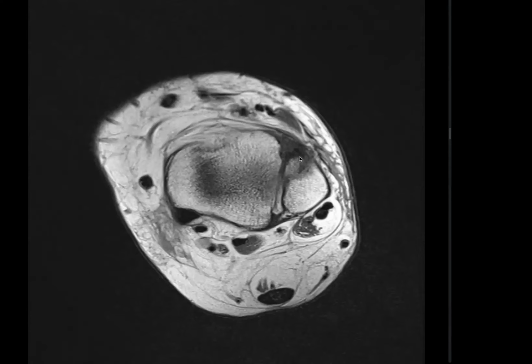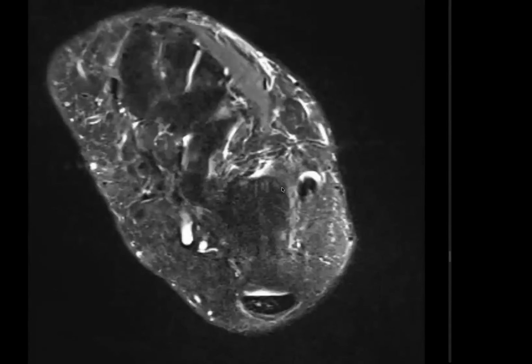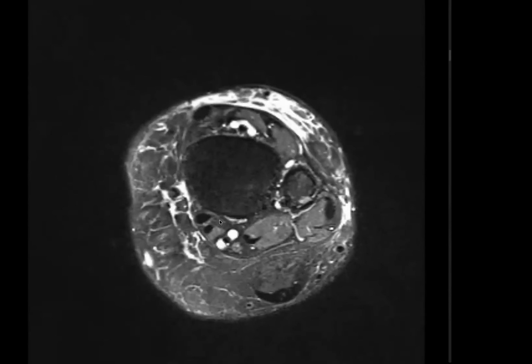Clearly, there is a lot of soft tissue gunk here, probably a slightly older injury, some chronicity, because there's not a lot of edema high up there, some edema, but not a lot. So slightly older injury. But you found the fracture, you send the patient to the orthopedic surgeon or call it fracture clinic or whatever. It's fine. Well done. Okay, sir. Thank you, sir.